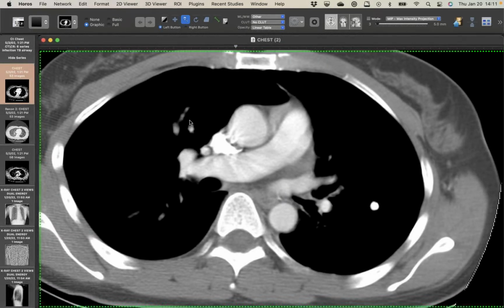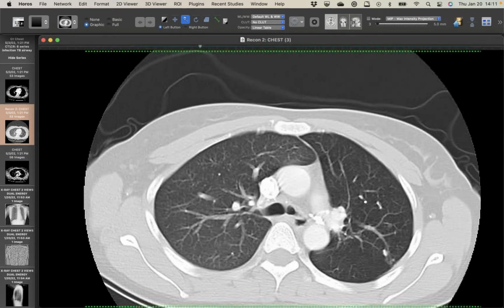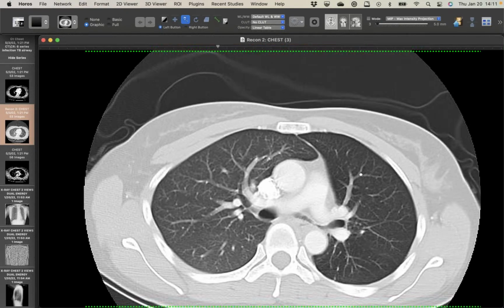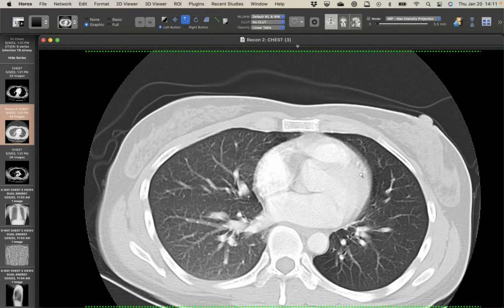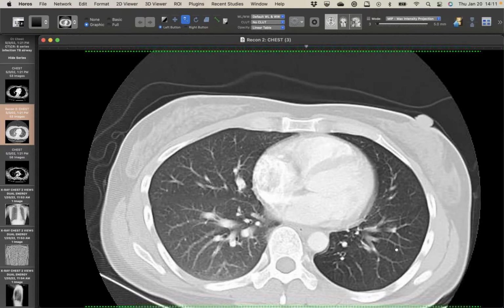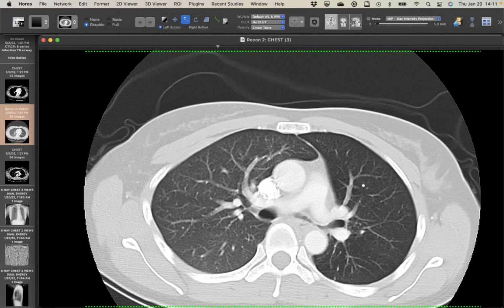And then if we look at the left lung on the lung windows, you'll see there's the asymmetry. So we see hyperlucent left lung, relative decreased number of vessels. All the lobes are there, they're just smaller. Not a big difference in vessel size, but I think it's enough, particularly in the periphery, they're just a little bit smaller. So this is a nice example of whole lung air trapping.